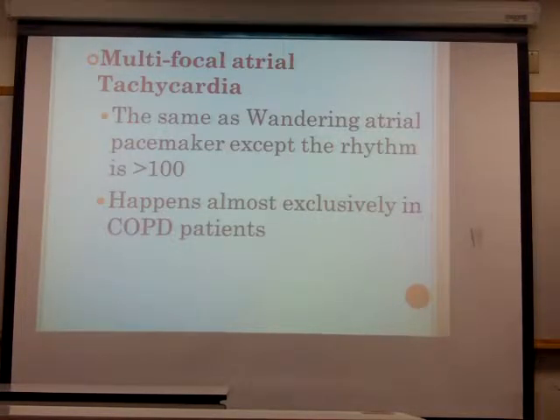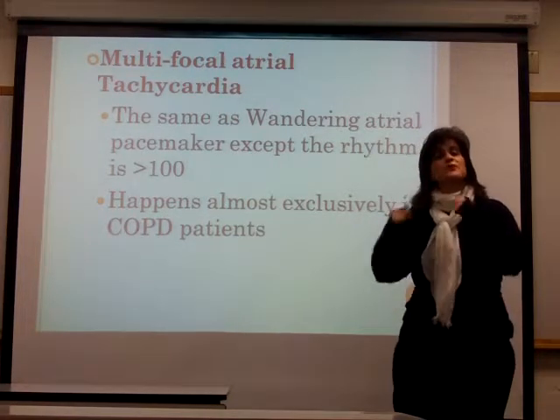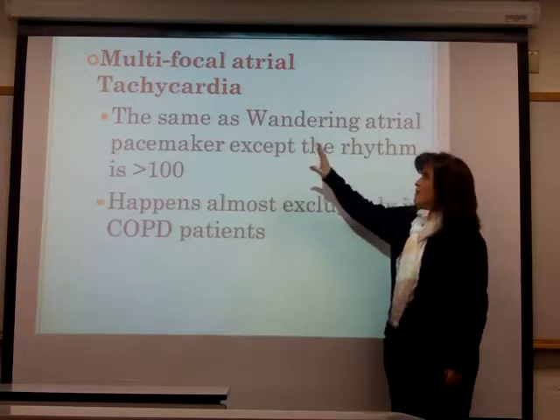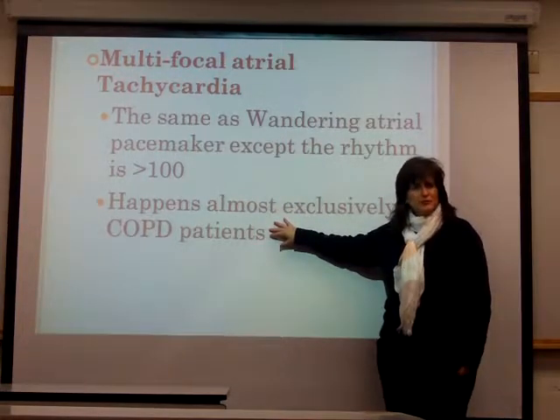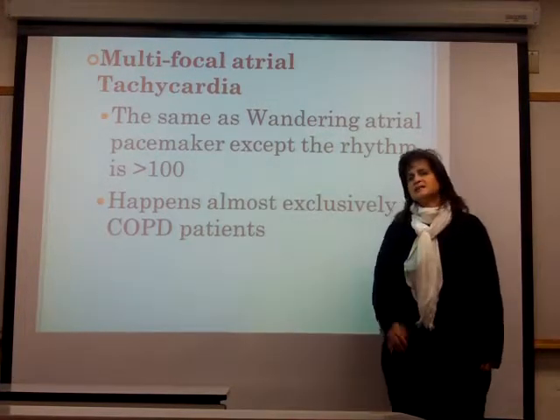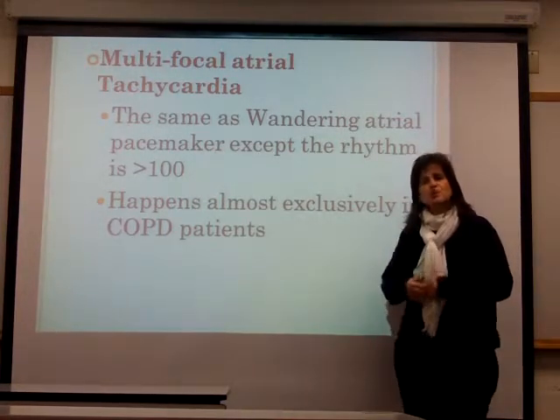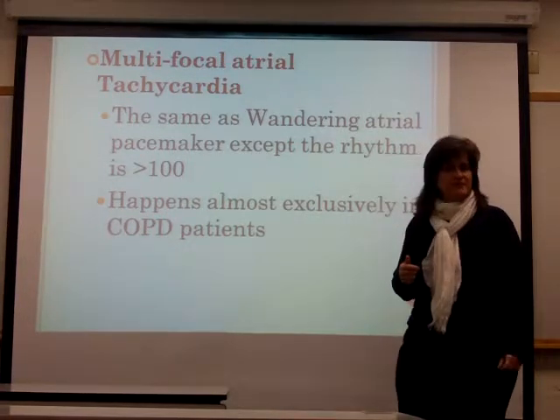Now, with a multifocal atrial tach, this is the exact same thing as a wandering atrial pacemaker, but the heart rate is above 100. Very unusual to see. This is typically the type of patient you're going to see a multifocal atrial tach in, where you have COPD, specifically if that COPD is exacerbating, because a diseased set of lungs will usually put a tremendous strain on a heart, and then that can cause a patient who's susceptible to their pacemaker moving for that wandering atrial pacemaker to jack itself up above 100.